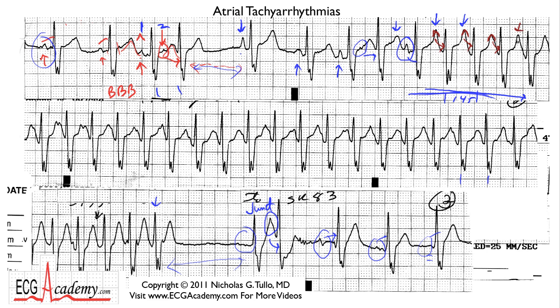Now you're saying, come on, Dr. Nick, how do I know there's a P there? Just because it's tall, what's the big deal? Well, if you keep on looking, look what happens. The P and the T start to split apart, and now you have two bumps. Remember, like the last strip, you had two bumps? The question is, which is the P, which is the T?